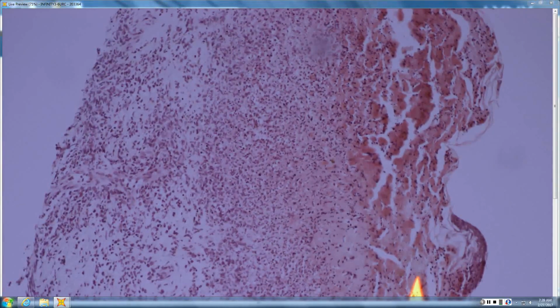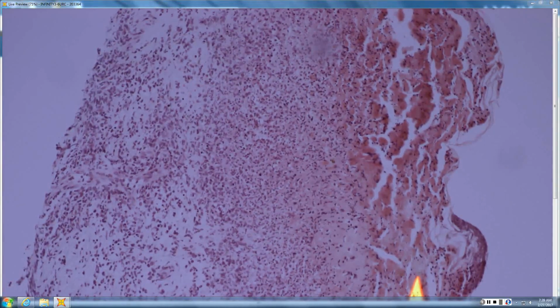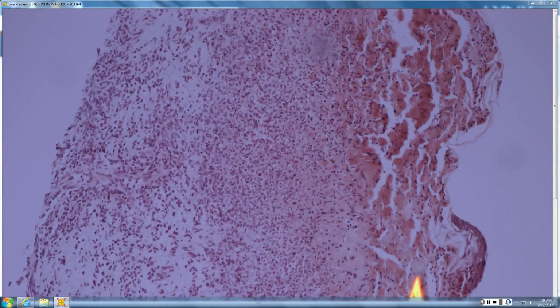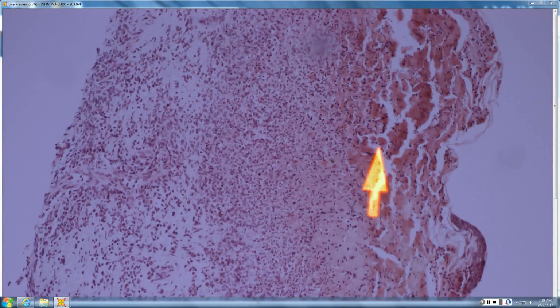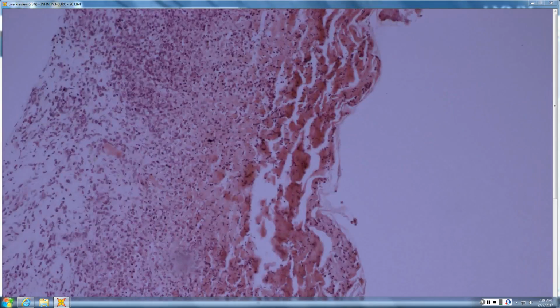It's actually a little better. Let's get the focus again here so that those on monitor are always in focus. Okay. So, how do you think the epidermis died? Are they holding together, or are they round and separated? They're a bit round, separated-ish.